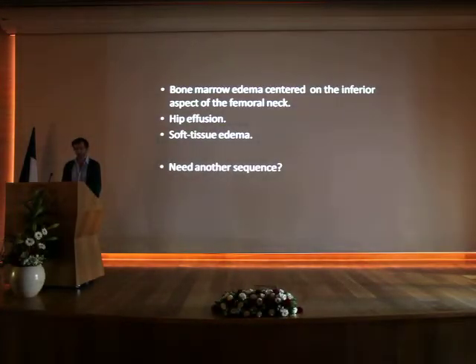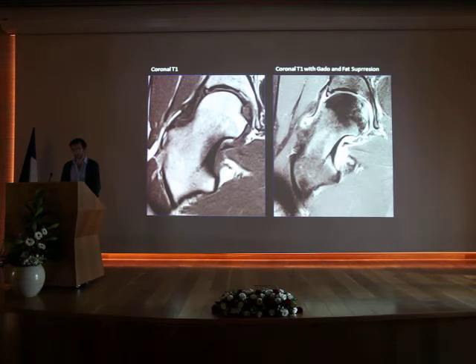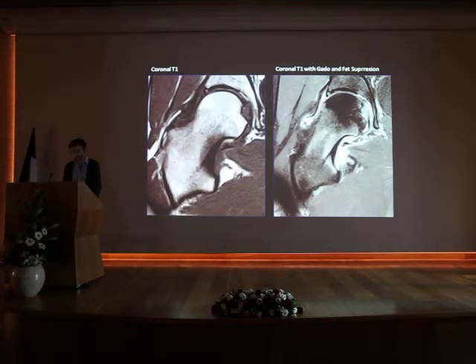So, do you need another sequence? Sure. Actually what we did was a gadolinium injection in order to study the enhancement pattern and to see whether or not the synovium was enhanced. The enhancement pattern was not specific, with diffuse enhancement of the edema and mild synovial enhancement.